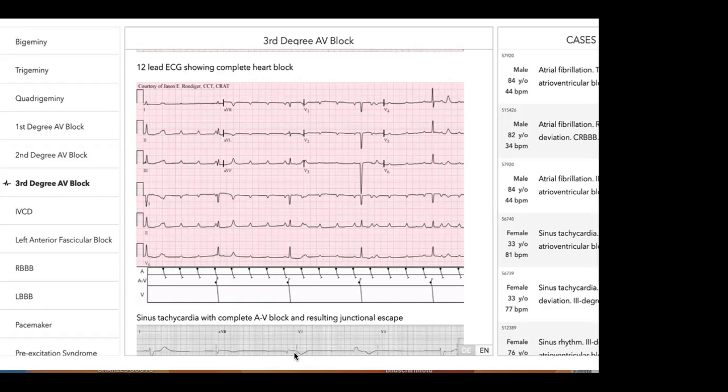If you spot an ECG like this, it is somebody that you don't send back home. It is somebody that you admit, you monitor them. Daniel, what do you call Holter in English? A long-time ECG. Right, you do a long-time ECG.